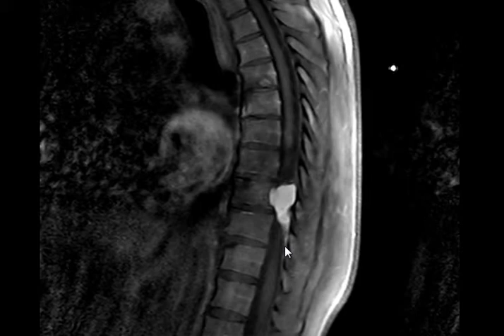So, in combination, all of these, you have a dural lesion, homogeneous, that is iso on T1, hyper on T2, enhancing, extending through the exit foramen with a dural tail sign, which results in it's a meningioma. So the trick here is to distinguish that this is a meningioma, and very close to it is hemangioma. There is meningioma and hemangioma.